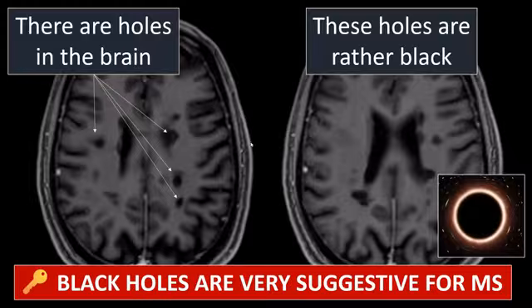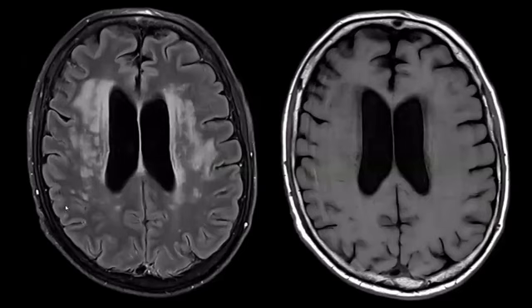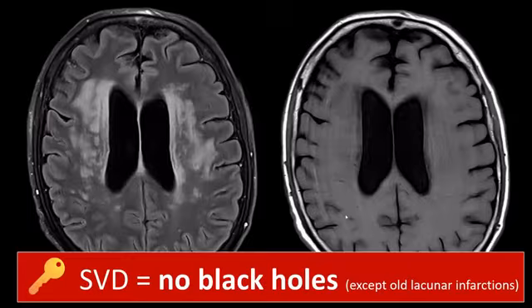And if you don't believe me, I'm going to compare these images with those of a patient with classical microvascular white matter changes. Here we see the FLAIR images. We see a lot of microvascular white matter changes. We see these changes along the ventricles and in the deep white matter. But if you look at the T1 weighted images, we don't see black holes. So as said, you can have black holes if you also have some old lacunar infarctions, but that will mostly be one or two old lacunar infarctions, not a lot, and not located immediately along the ventricles.